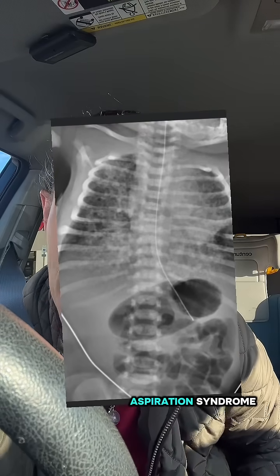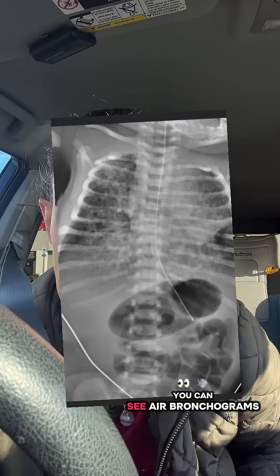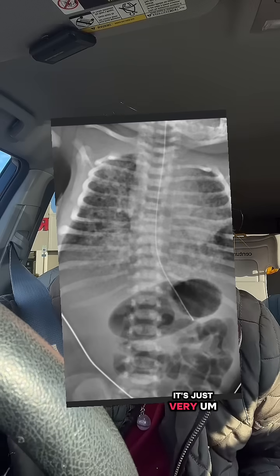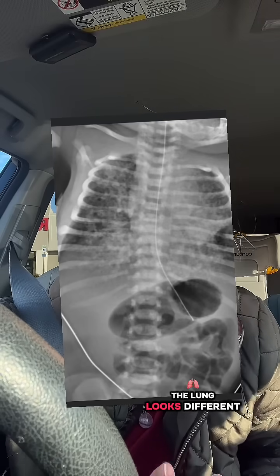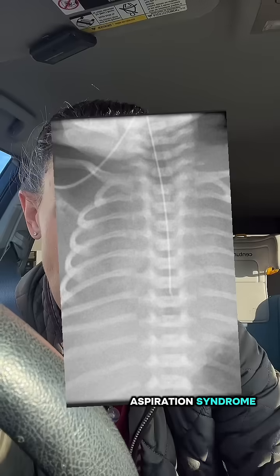Here's another. This one is meconium aspiration syndrome, and you can tell because it's super, we call it fluffy. You can see air bronchograms, those little black dots throughout the lung field. It's very heterogeneous throughout, so the lung looks different in each area of the lungs. Very consistent with meconium aspiration syndrome.